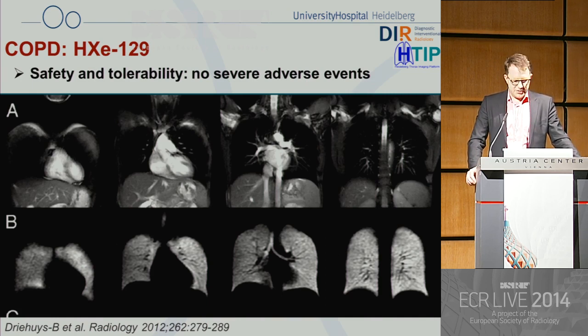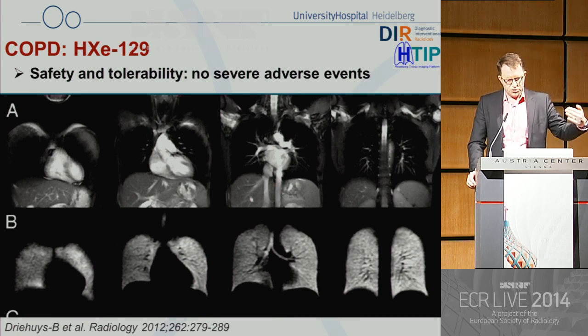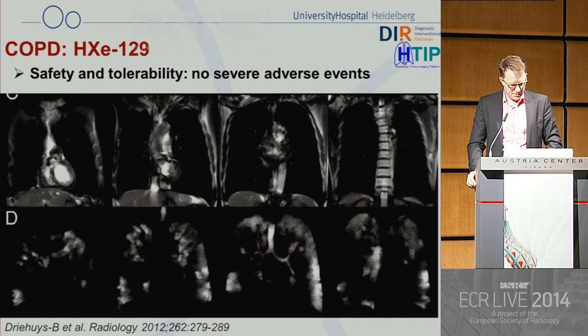Again, with hyperpolarized xenon, safety and tolerability have been proven. And you see the combination of contrast-enhanced perfusion and contrast-enhanced hyperpolarized xenon ventilation maps. And this is COPD. So you see the big difference on the perfusion side and on the ventilation side.